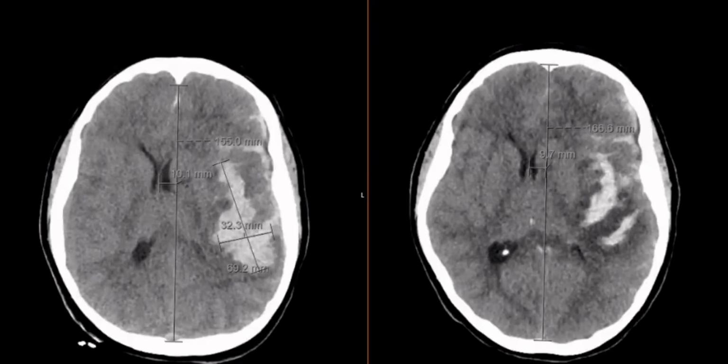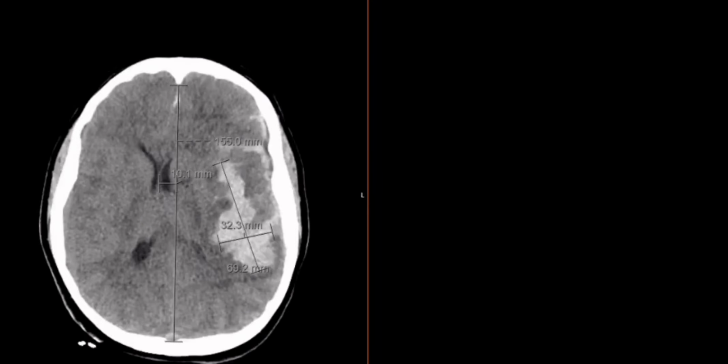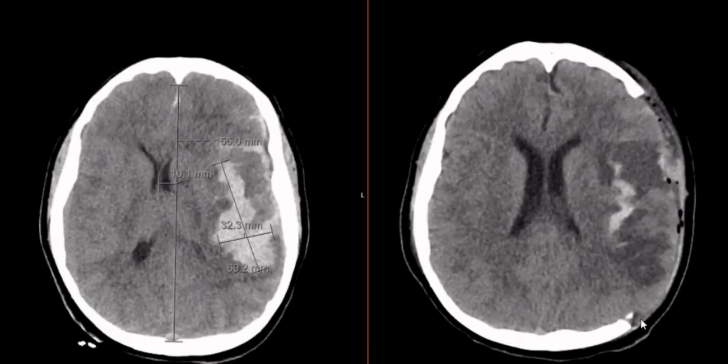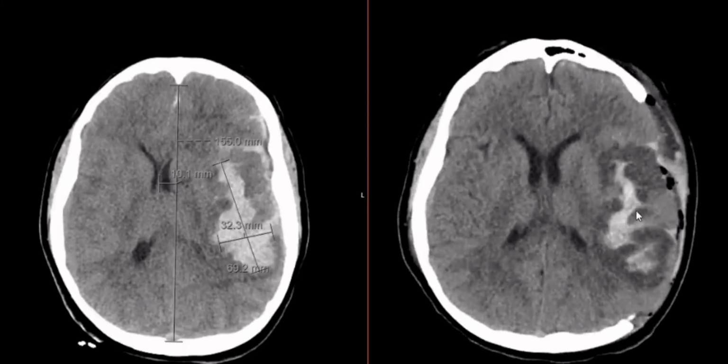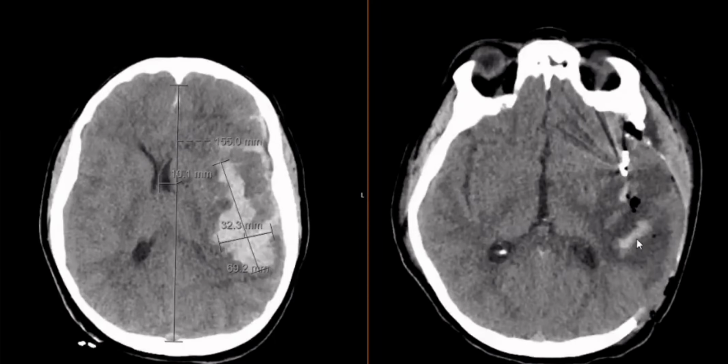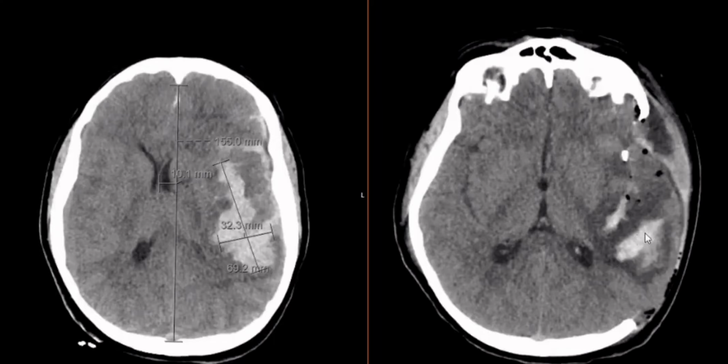So what was the solution to their problems? Well, fix the fixed space issue. Let's go to this one. Now, around the same area, we had bone all the way around, and now we have craniectomy. And do they look like they've evacuated some of this hematoma? Yeah, so there's less blood to some degree. Yeah, partly, but it's very hard to get at sometimes. The stuff in the Sylvian fissure you can get at, but this is in the brain.